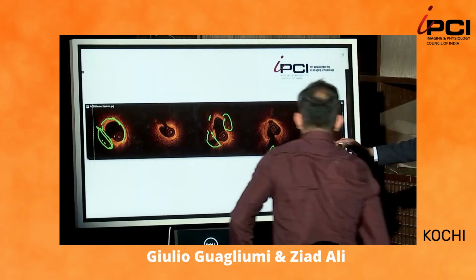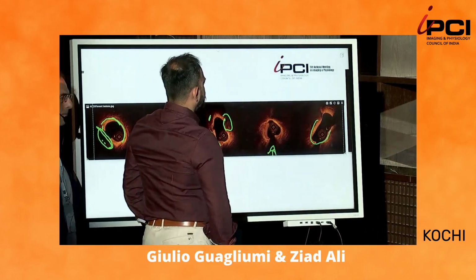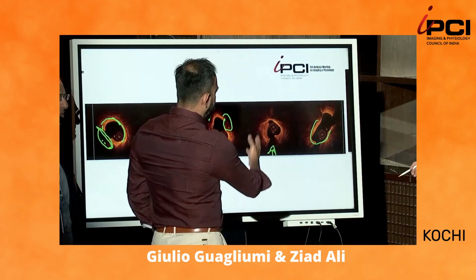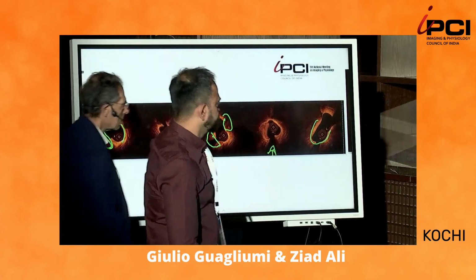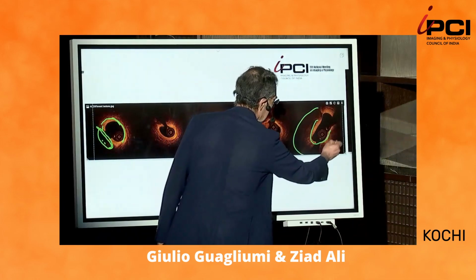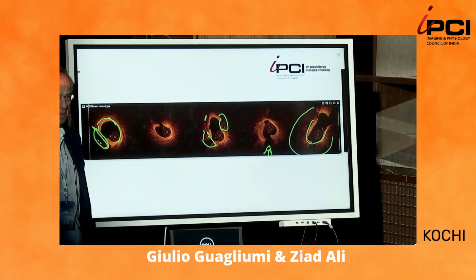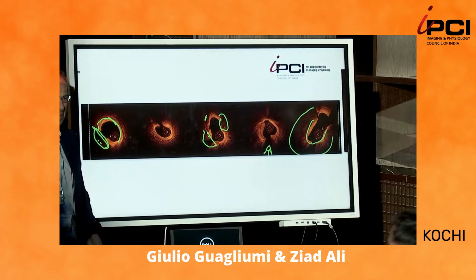Comments about the ostium? You have a lot of segment of calcific disease. Yeah, so it's a deep calcium. So maybe one IVL or something. Okay, and the angle is this one. IVL. Rotational? Why?